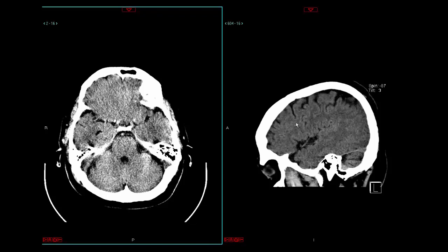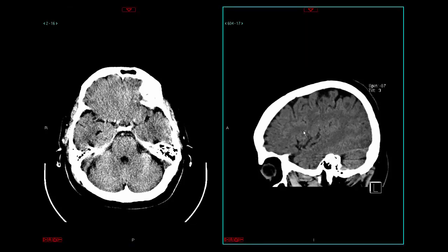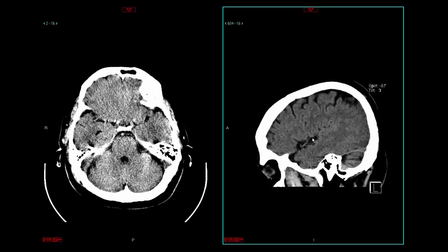Let's turn our attention a little bit to the sagittal imaging once again. I want you to appreciate that lateral or sylvian fissure there. A couple points I want to make about some of the cortex that's marginating things on the sagittal imaging. The cortex that's marginating the sylvian fissure here is going to be called the supramarginal gyrus. And that sits right there.